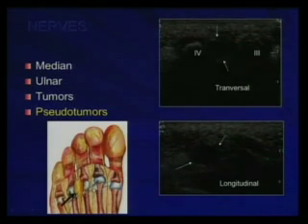So if you use high heels, this transverse metatarsal ligament may irritate the nerve by compression, and you may have fibrous tissue and this mass that is called Morton neuroma. So we can see it here between the head of the third and fourth metatarsal, and you can see this solid mass here and this solid mass at this level.